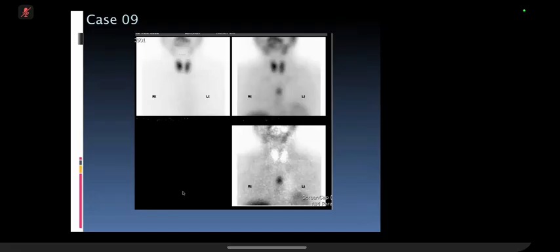So we have here a nuclear medicine study of the neck, which shows uptake in the thyroid as well as focal tracer uptake more inferiorly, and given that it's taking a similar level of uptake to the thyroid, I'd consider ectopic thyroid as a possible cause for this. I'd recommend ultrasound imaging to assess this nodule.